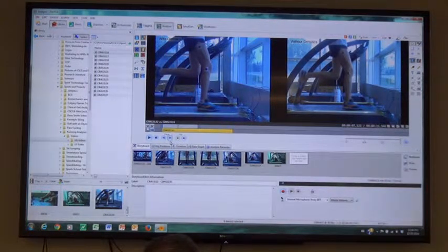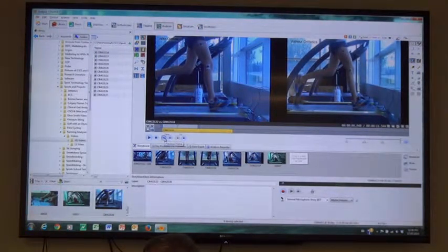So if I go back to that contact again, right there, I would draw an angle and see what the differences are between the right and the left, or between the orthotic versus non-orthotic conditions. And a little bit more flat-footed, I guess, if you will, in the orthotic conditions. So I'm not exactly sure what that means right now, but we're just making some observations based on different angles.